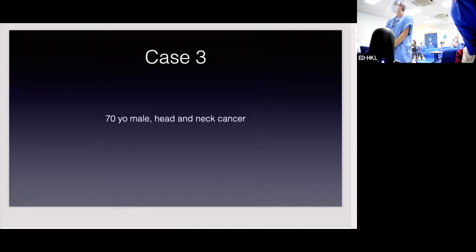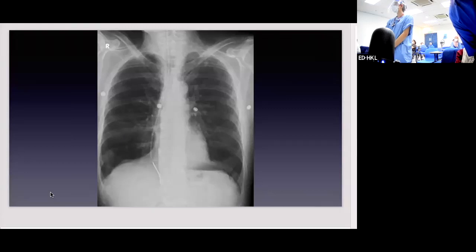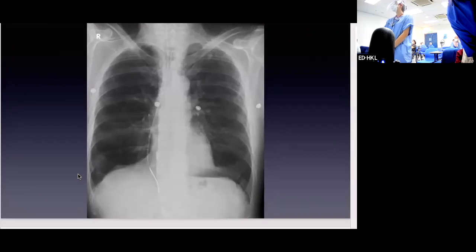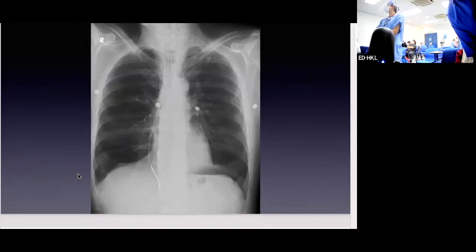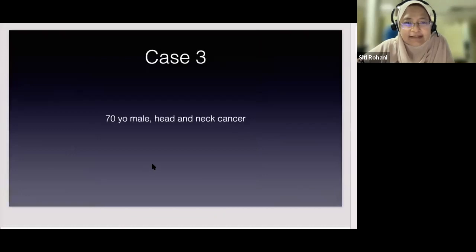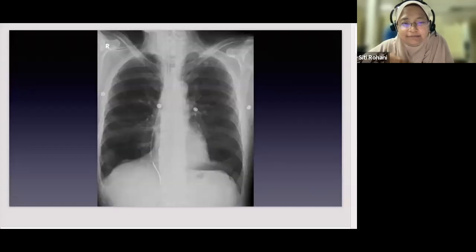Any history of COAD or smoker? Because it's almost impossible to go through the vocal cord, right? The head and neck. Patient had head and neck cancer. So probably the vocal cord is, maybe they intubate beyond the vocal cord. I'm not sure about the COPD history.